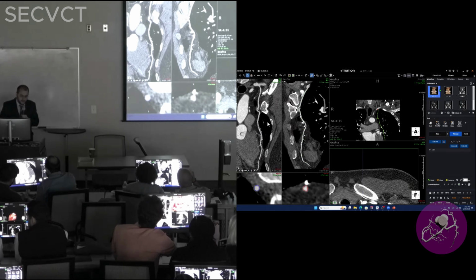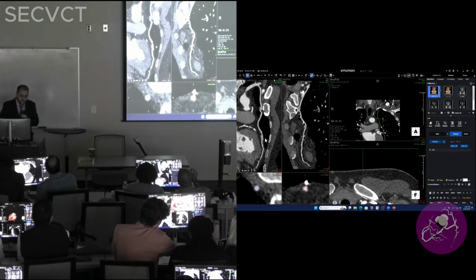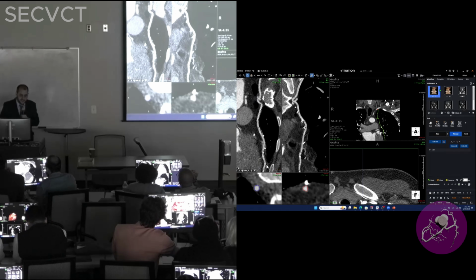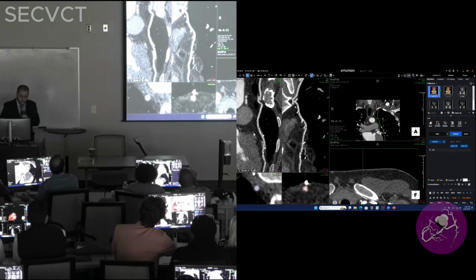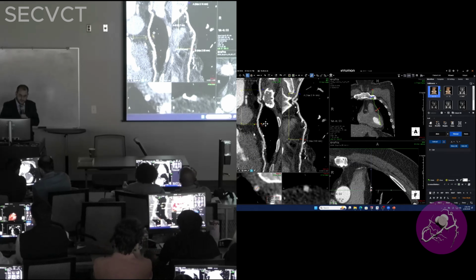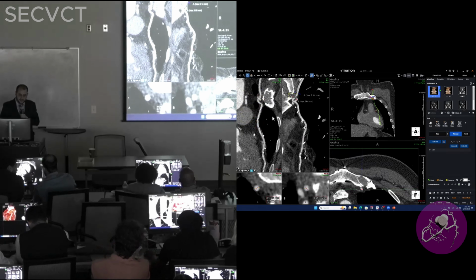And yeah, here you can see it gets attached to the distal LAD. You see that the LAD appears like this here. It's heavily diseased. This is the distal anastomosis down here. And that's the distal runoff, okay, which has some mild stenosis. Obviously, we look at that in the cross-sectional views like this. So mild disease, distal LAD, distal runoff, and unobstructed Lima graft with patent proximal and distal anastomosis, I would say.